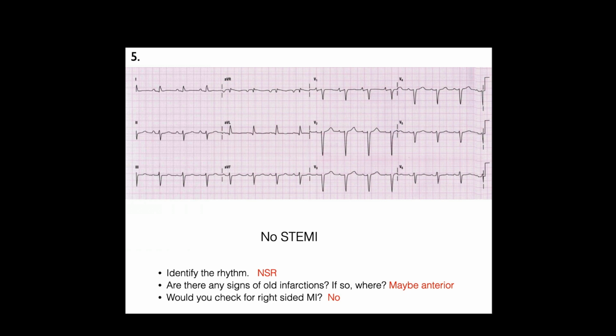Was measuring the PR, is that close to a first degree? Let's see. I wouldn't put it... Is it supposed to be 3 to 5 or longer? Yeah, greater than 5, so maybe it's kind of right on 4 to 5, so I don't think it's there. Alright.